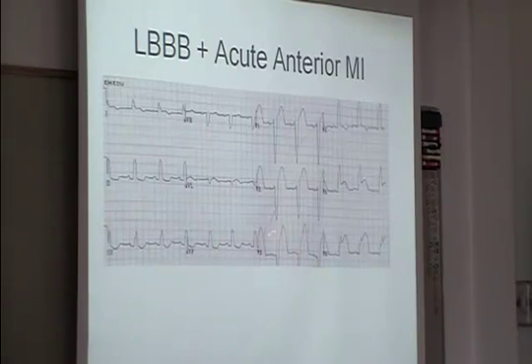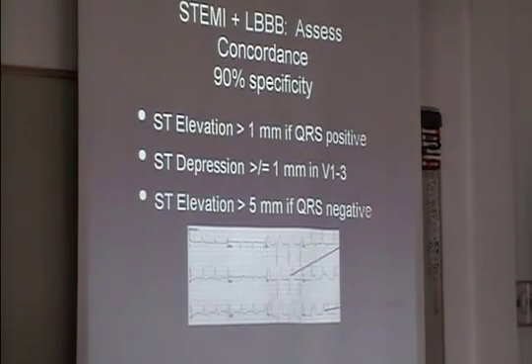And that would apply here, you see. So the S waves are down, the ST elevation is very high on the other side. But even this little bit of 1 millimeter here in this lead, where it's concordant, could indicate ST elevation myocardial infarction. So this is just drawing that graphically.